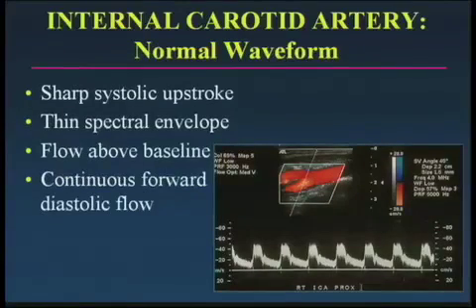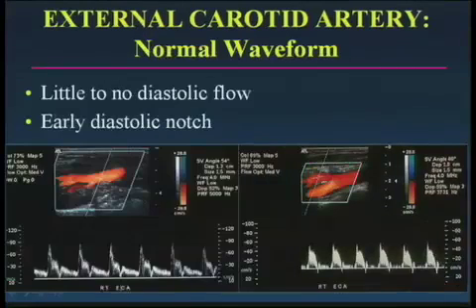You ought to characterize the waveform as well. And the normal waveform of the internal carotid artery is as you see here, and is characterized by a sharp systolic upstroke, a thin spectral envelope, flow above the baseline, and continuous forward diastolic flow.